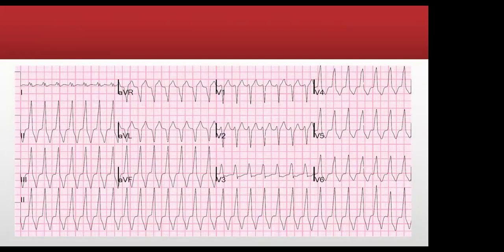What was this? Remember the other one we looked at the other time? So this is regular, right? Yes, this is regular. So it could be SVT with aberrancy.